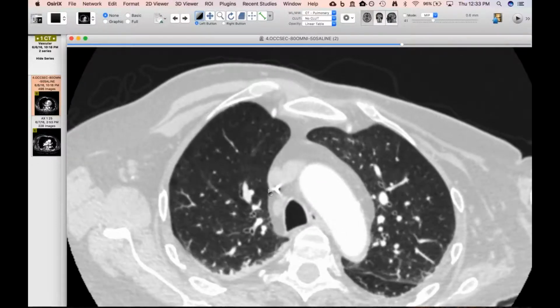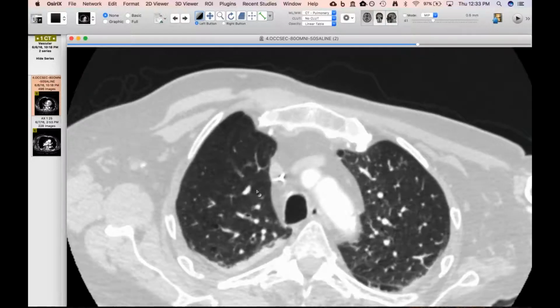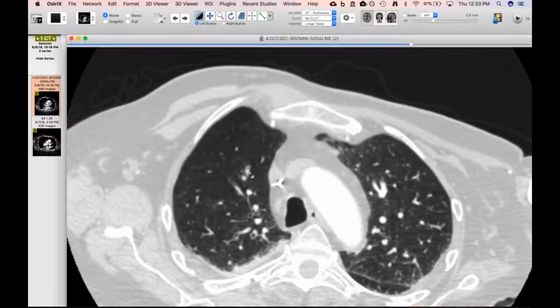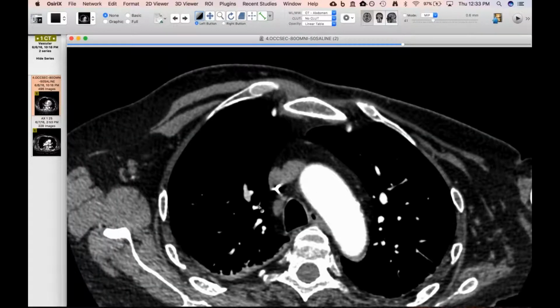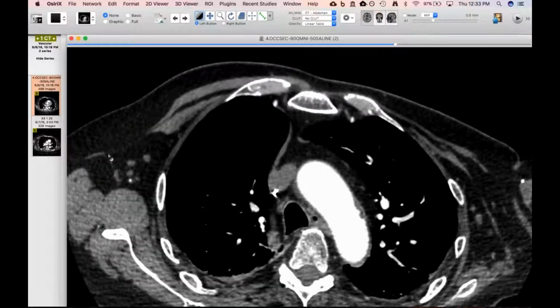So just again underscoring the fact that you shouldn't have either two airways or two vessels side by side, and I think you can see it going up into these branches as well, where you have it paralleling the airways. And I think that as a result, you had that little air causing slow flow and caused the contrast in this portion to be a little bit lower attenuation.